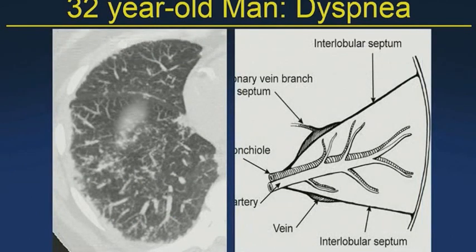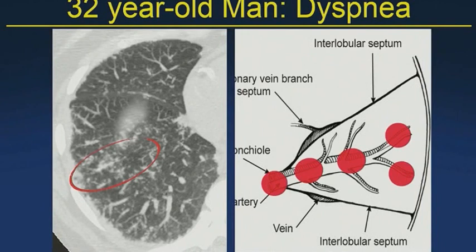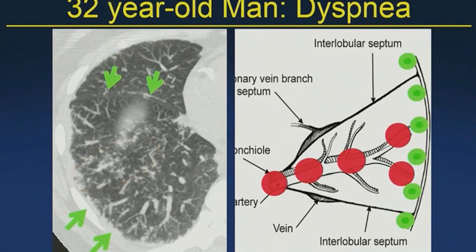So if we look at the relationship of the nodules to the secondary pulmonary lobule, we see first and foremost that we have nodules which are clustering along bronchovascular bundles. And out here peripherally, we'll see that they cut in cross-section would appear as centrilobular nodules. But the other characteristic feature here is the fact that there are nodules which are aligning themselves directly along the pleural surfaces out there peripherally, as you can see here, and along the fissural pleural surfaces as well.